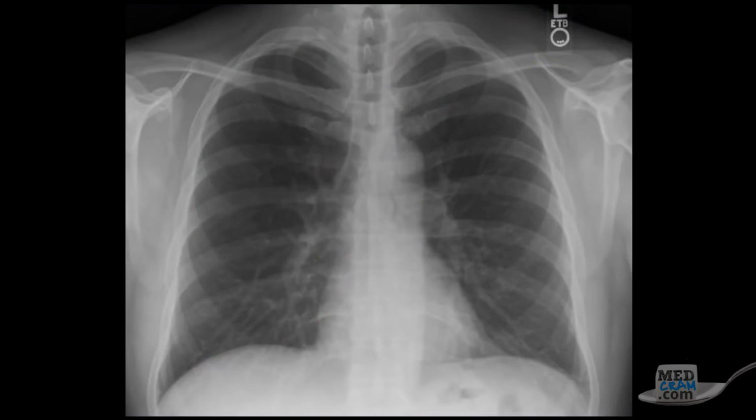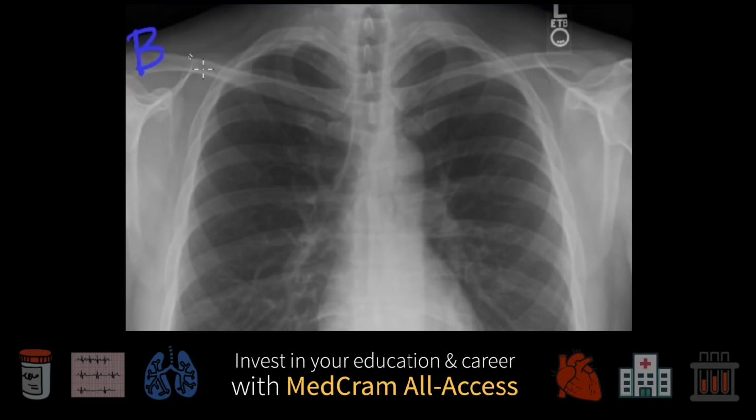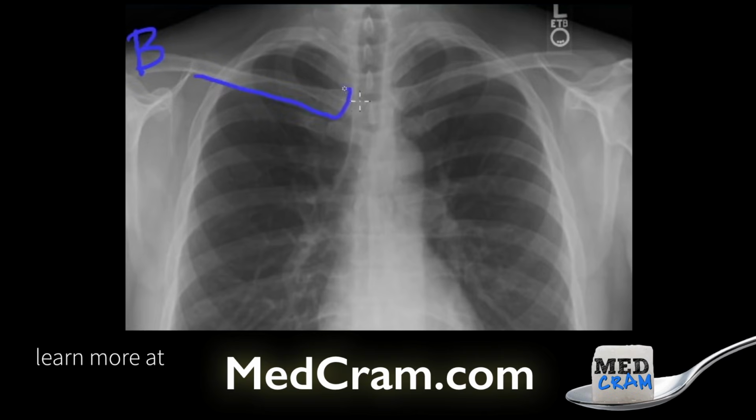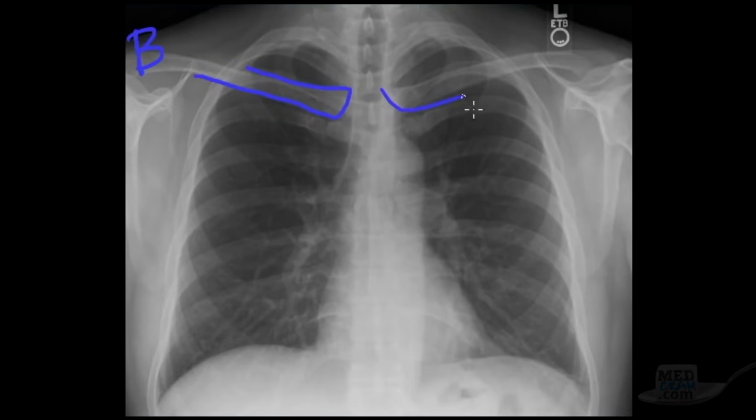Well, the next thing I like to look at is B, or bone. So I like to look at and compare the bony structures, paying very close attention to site, size, shape, shadows, and borders. You've got the clavicles right here. Okay, so you can look for any kind of fractures. You'll notice here there's like a cacophony of ribs going by.